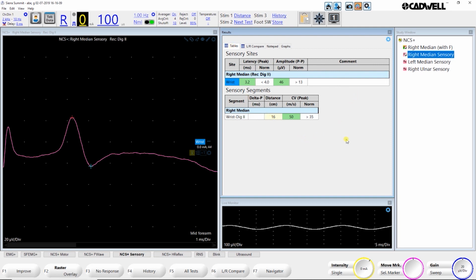And that's probably enough for this video. I don't want to make these too long, but hopefully that gives you a taste of how NCS Plus works. Please refer to the help manual for any additional questions on functionality or setup. Thank you.